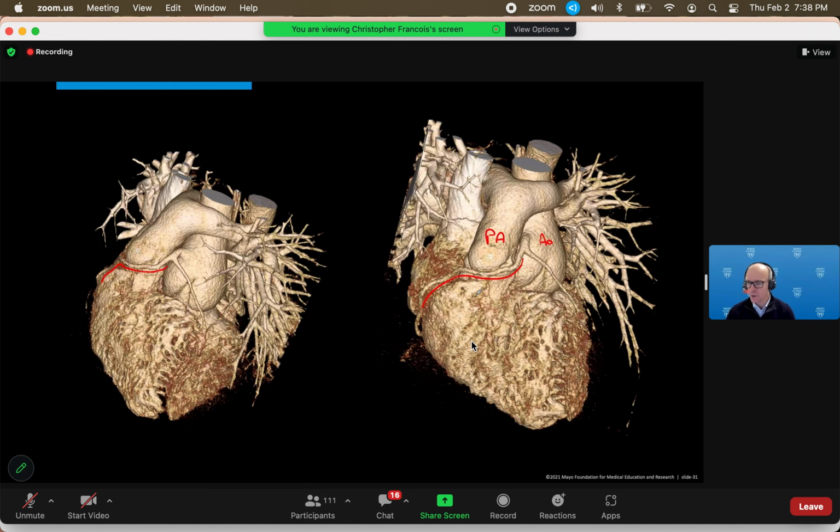And then, as you mentioned, it would be important if they were going to undergo cardiac surgery or have a sternotomy. It would be important for the surgeon to know that they've got a coronary artery right behind the sternum. And to answer Rasha's question, the intramural course is what we would now consider to be the malignant course. And that would be an indication for surgery, particularly if they have chest pain.